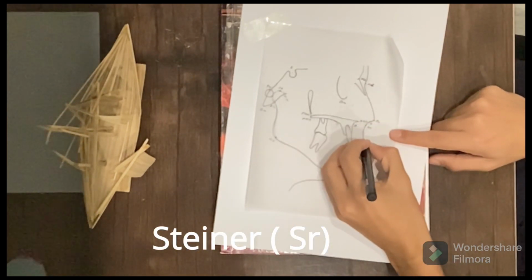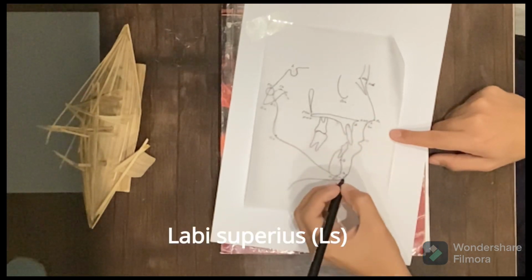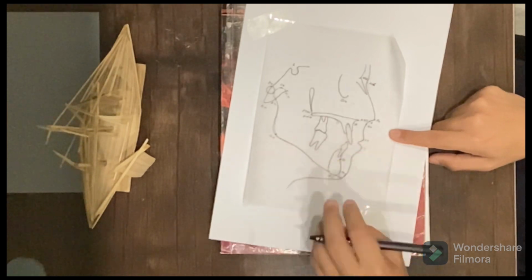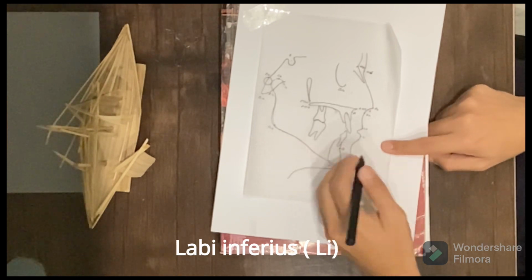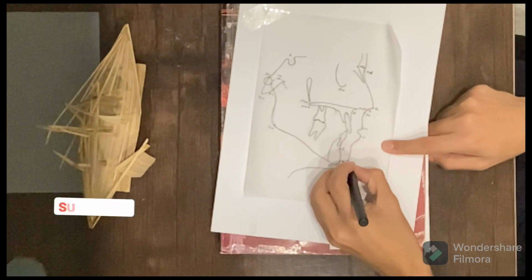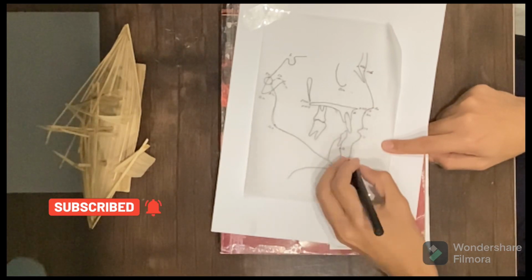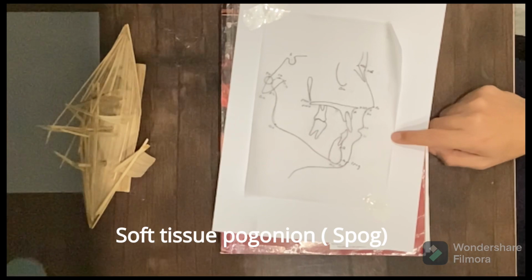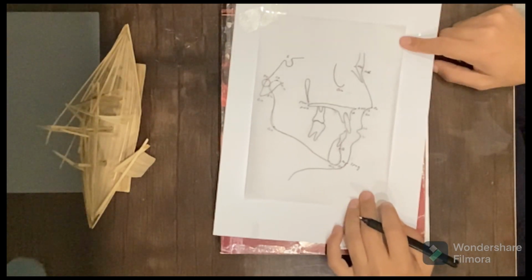Now the most projecting anterior part of the upper lip is called labrale superius, while the most projecting part of the lower lip is called labrale inferius. Okay? And moreover, the most projecting soft tissue part of the chin, overlying the skeletal Pogonion, is soft tissue Pogonion. So these are the landmarks which are present on the soft tissue.